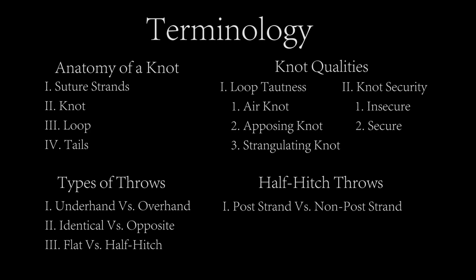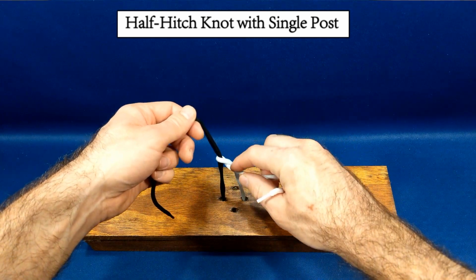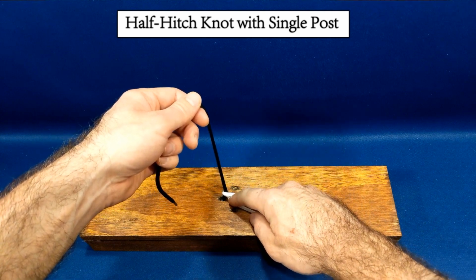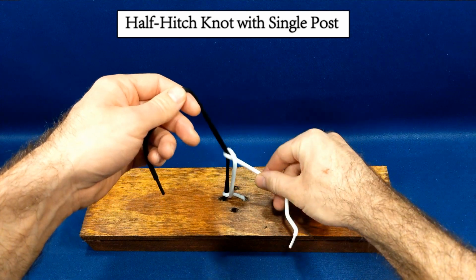Every throw can either be tightened on the same post as the previous throw or on a different post from the previous throw. A half-hitch knot with a single post results when two throws are tightened on the same post strand. For example, here an overhand throw is performed and tightened using the black strand held by the left hand as the post strand. Then an underhand throw is performed and the throw is tightened once again using the black strand held by the left hand.